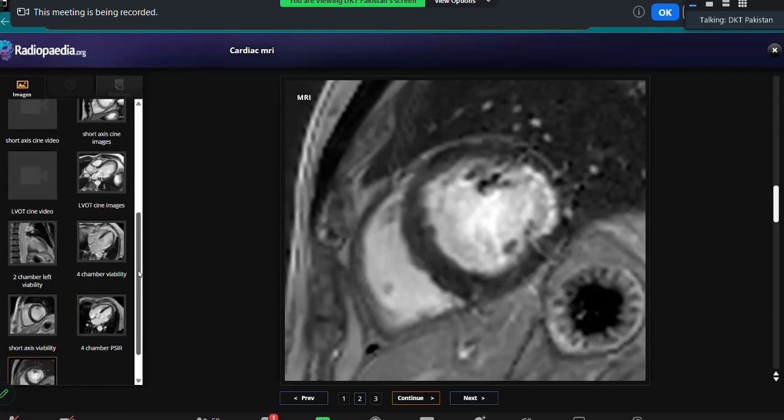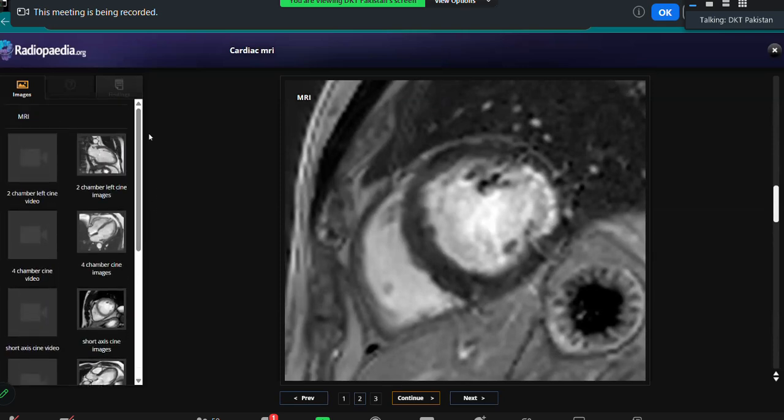The other thing that is important to mention is that the left ventricle was dilated. There is an infarction. The cardiac function is reduced as well. So this is leading to an ischemic cardiomyopathy. In case of infarction, and then there is dilatation of the heart as well as reduced cardiac function, it will lead to an ischemic cardiomyopathy. Basically, it is a dilated cardiomyopathy.